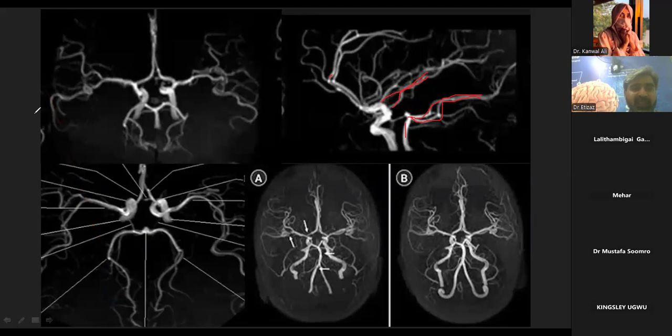Sometimes angiography is confusing. That's why you have to be careful when such kind of images are there. You have to first think about how it is correlated. Look, right and left, right and left, right and left. Later on in the angiogram, we'll see how it is there.